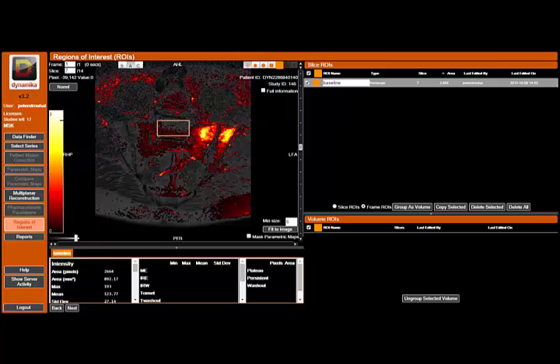Essentially, you can then highlight all pixels which have intensities above your healthy tissue taken as baseline, and you can adjust exactly where that baseline image is and what those values represent as well.